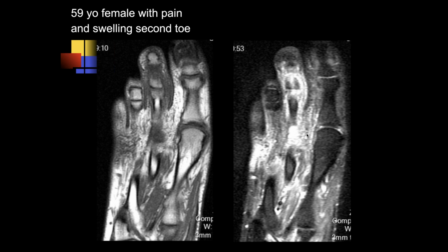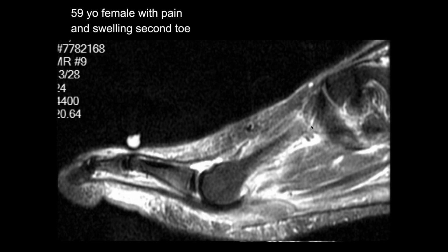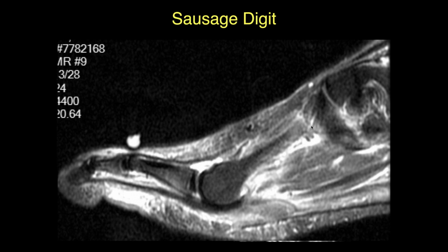There's soft tissue edema and bone marrow edema involving that second phalanx, and I believe that's involving the joint as well. That's not volume averaging, correct? Correct. Yeah. There are the coronal images. So on the coronal images, we can see the extent of just kind of diffuse extensive soft tissue edema. On the coronal, the bone actually looks cleaner. Right. I don't see, at least on that cut, definite bony edema. Neither do I on the sagittals. So kind of just diffuse.